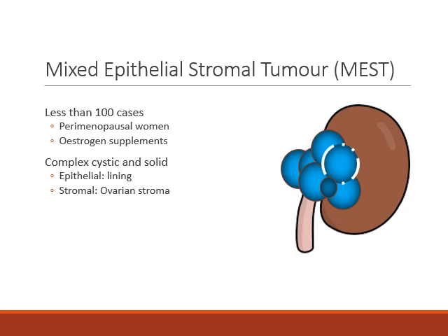The key here, what you need to know, is that you can't confidently say it's not a cystic RCC based on imaging alone. All of its features can pass off as features of cystic renal cell carcinoma. So what are those features? It's usually a multiloculated mass herniating into the renal pelvis with lots of thick enhancing septae, mural nodules and calcifications, and sometimes also intralesional hemorrhage.